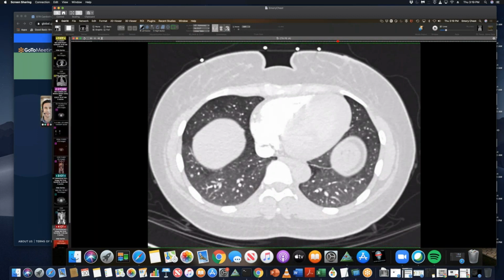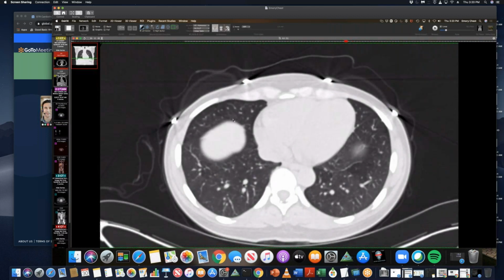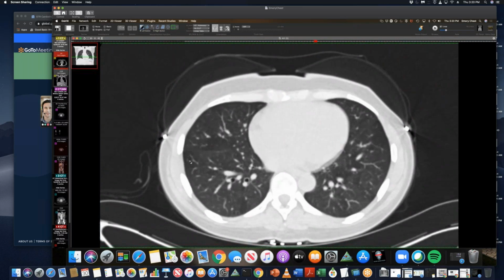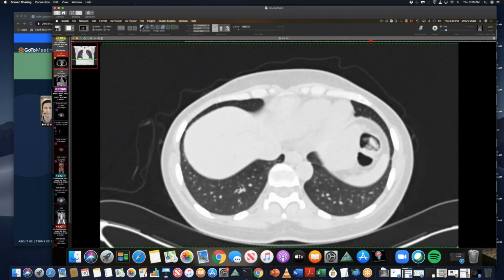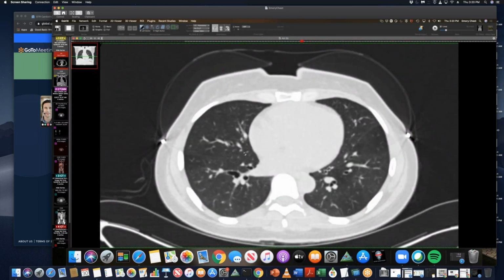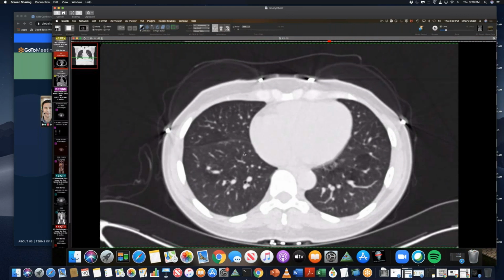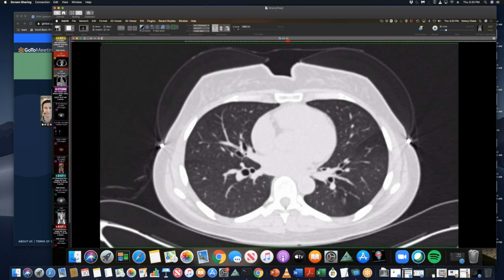I'm going to show the most recent CT. It's actually not significantly changed. Very, very small interval growth in some of these nodules. And then the mosaicism on this CT is still present, you can see lower attenuation here, not as pronounced. Maybe it's due to expiratory phase, but you can see some of the nodules. So I'm wondering, do you guys think this is just typical for paraganglioma mets to look similar to DIPNECH? Or have you seen that before? Because I haven't seen many paraganglioma mets to the lungs.